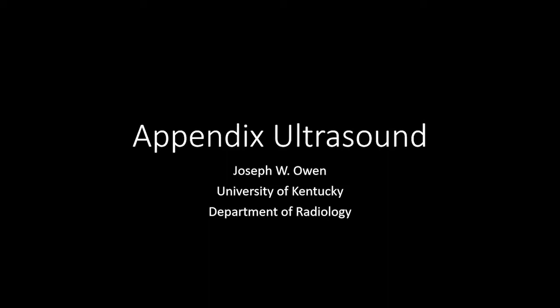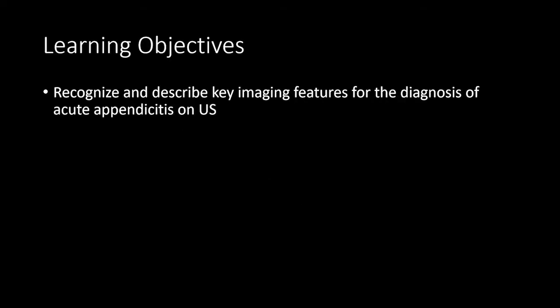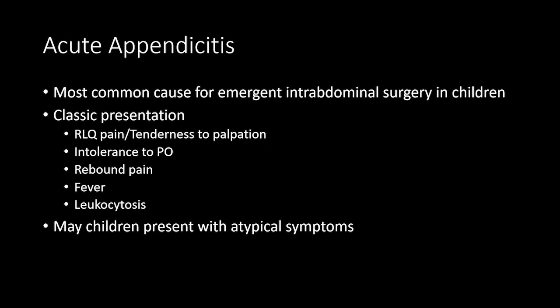In this screencast, we will discuss ultrasound of the appendix and how to diagnose acute appendicitis. At the end of this screencast, you should be able to recognize and describe the key features for diagnosing acute appendicitis on ultrasound.